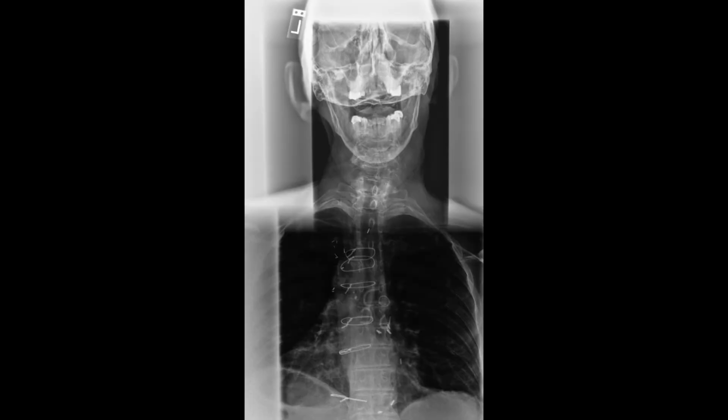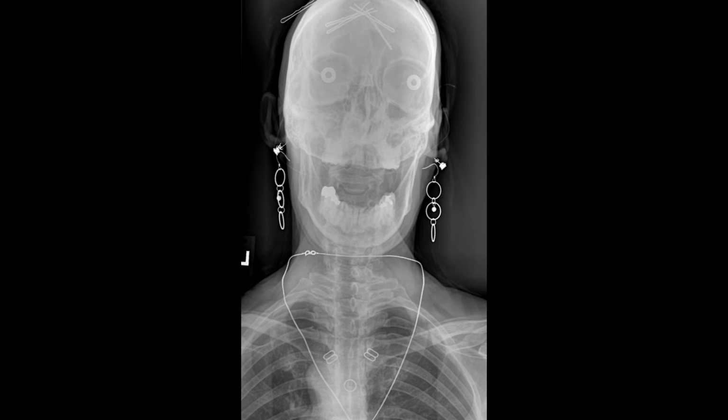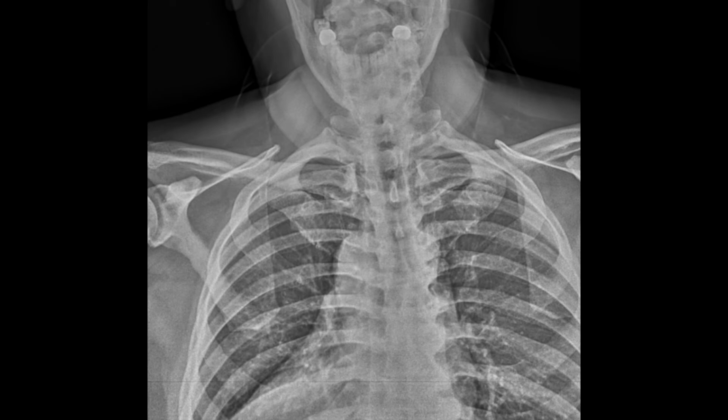Here is another example of a cervicothoracic view where you really can't evaluate the cervical spine or thoracic spine well. Remember, this is a frontal view of the cervical spine, and the cervical spine is not seen due to technical and positional factors, which renders this film non-diagnostic. And this is a pretty standard example of this modified cervicothoracic APOM view, and you just can't really see anything very well. In this view, the combination of poor technical factors and positioning limit assessment of the cervical spine.